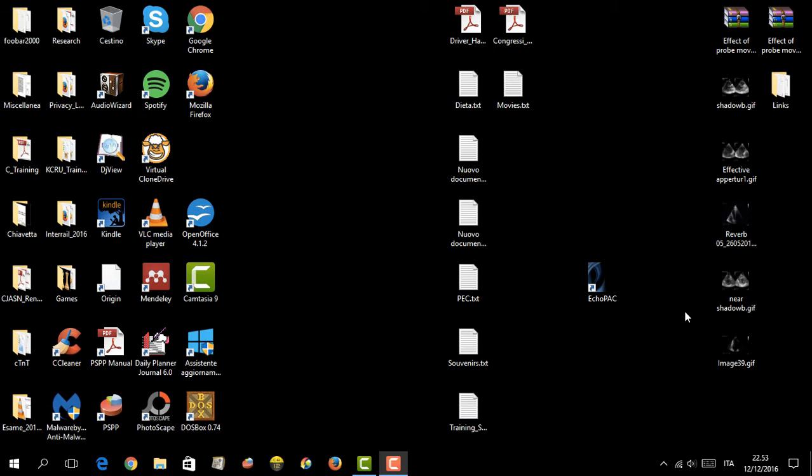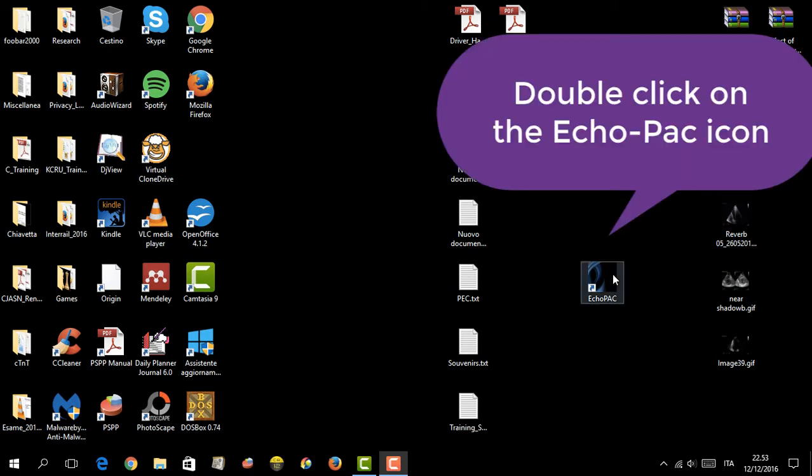Hello fellas, I would like to show you how to operate the Echo-Pac program for the analysis of strain in echocardiography. So for starters, let's open the Echo-Pac program, clicking on the icon.